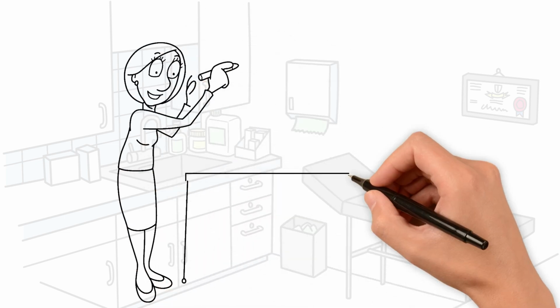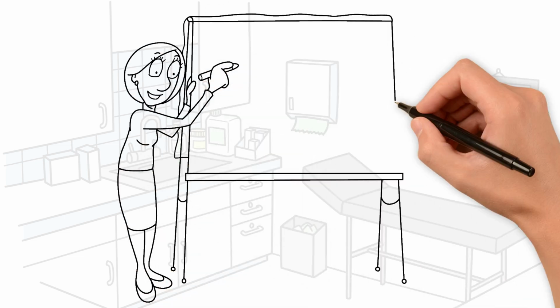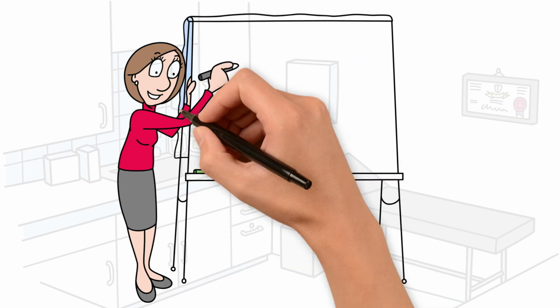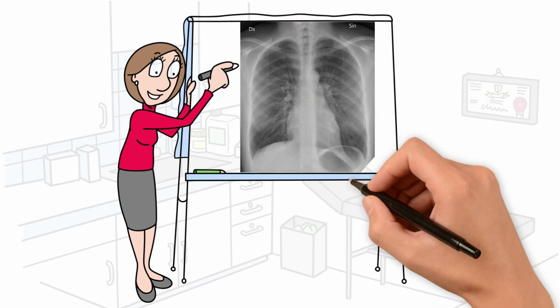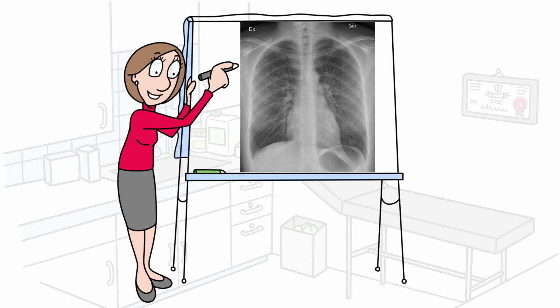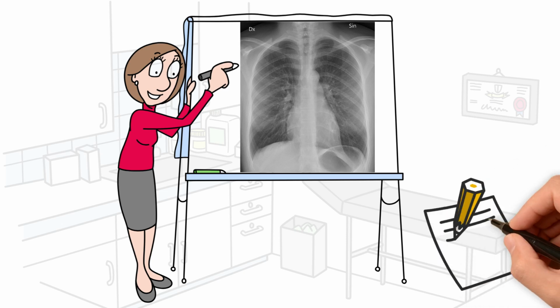Chest X-rays can look intimidating, but today I'm going to show you how to read them step by step. Whether you're a medical student, a nurse, or just curious about learning chest X-ray, this video will help you spot the key findings with confidence. Let's break it down, simplify it, and learn the systematic approach professionals use every day. Let's get started.